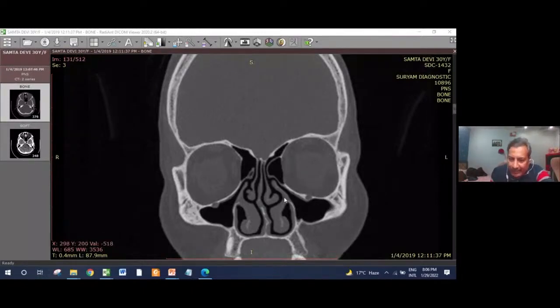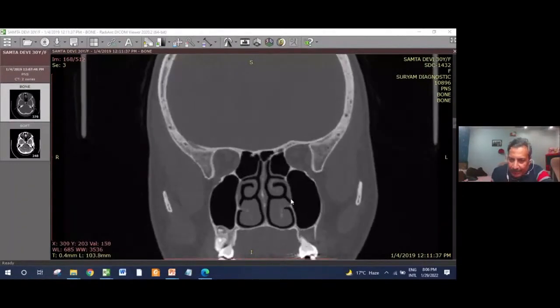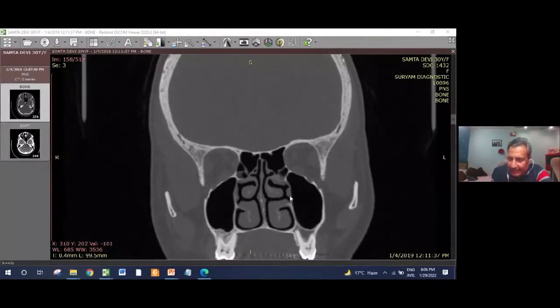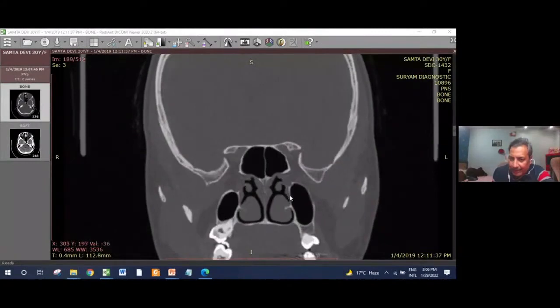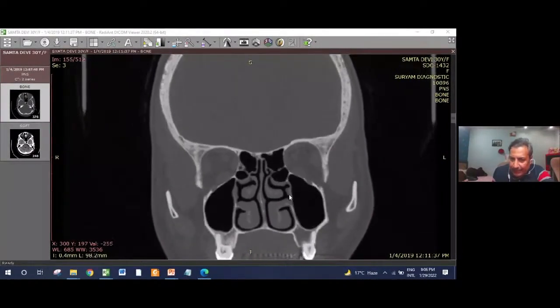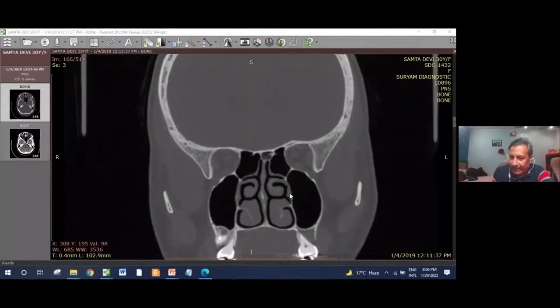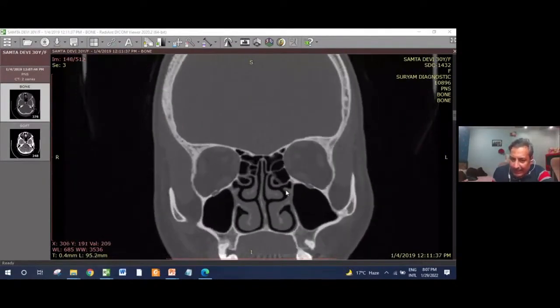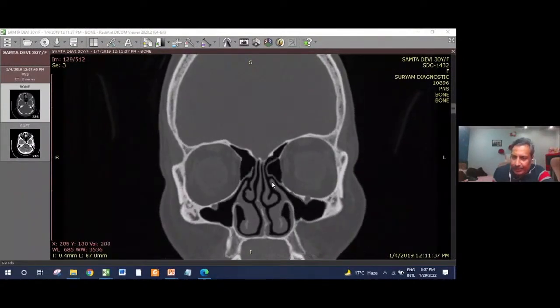See this, what exactly is this? Let me run it in a dynamic way, coming from posterior to anterior. See this uncinate process. I'm coming from posterior to anterior, and it has a horizontal part. I'm coming anteriorly now from here. This is the uncinate process, which has a horizontal part. Now it's a vertical ascent. See this, going back. This is the horizontal part of the uncinate. That's the vertical part ascending, ascending, ascending. See how the uncinate is going up.